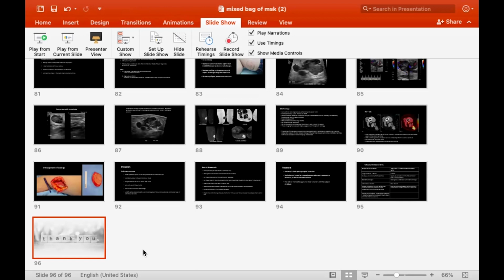No, that's absolutely right. But I also agree with Dr. Ketkar on a very important aspect that every time you come across a popliteus injury, it's mandatory that we should look at the lateral meniscus and also the capsule, because the capsular tear and the tear of the lateral meniscus, the posterolateral component, go hand in glove.